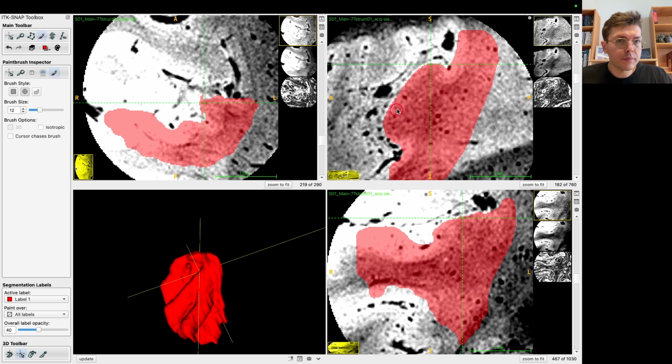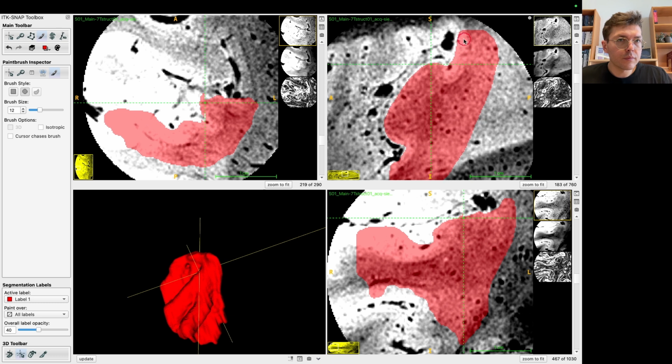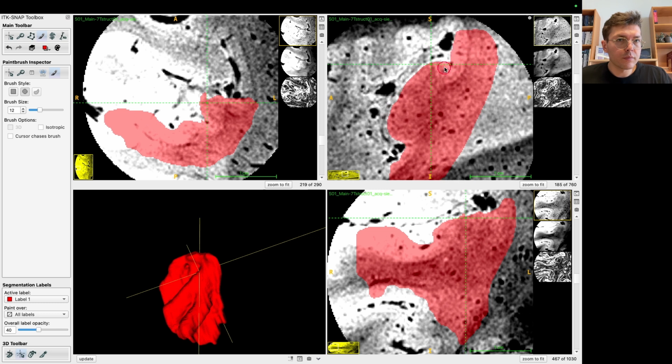So as you see now, I'm going through a bit more in detail.